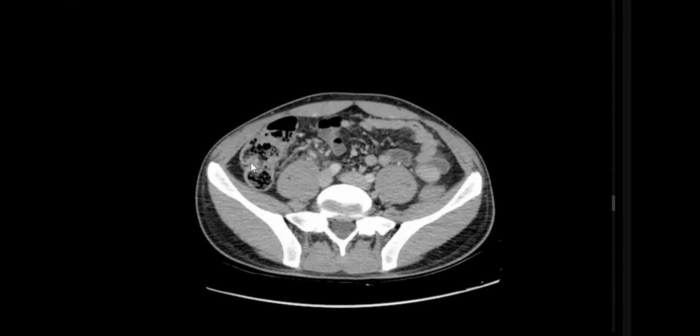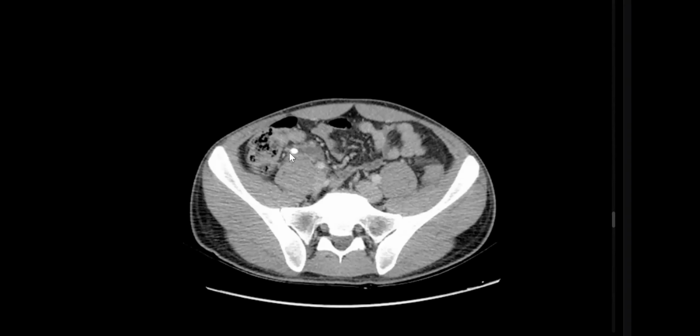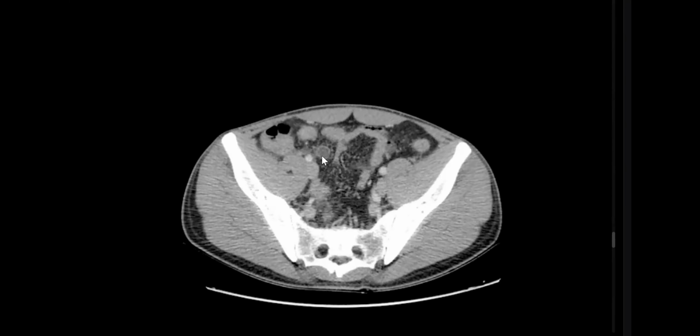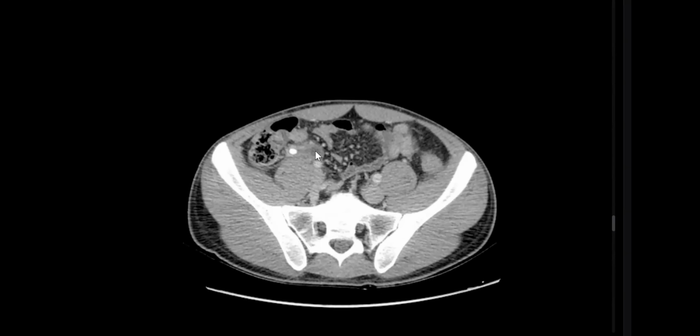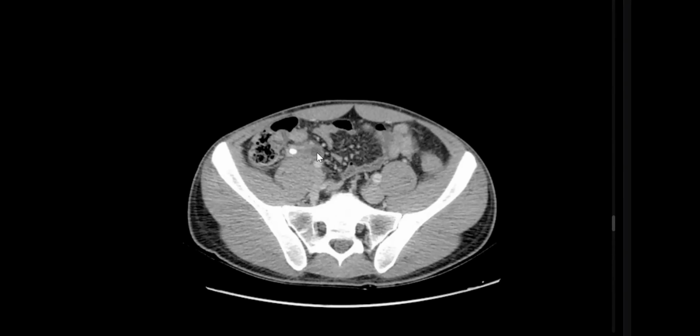Straightforward. You see another case of acute abdomen. This is a clue. Concentrate on this one. We have a tubular structure, and it contains a hyperdense appendicolith. In the exam, most likely it's the appendix. But take care.